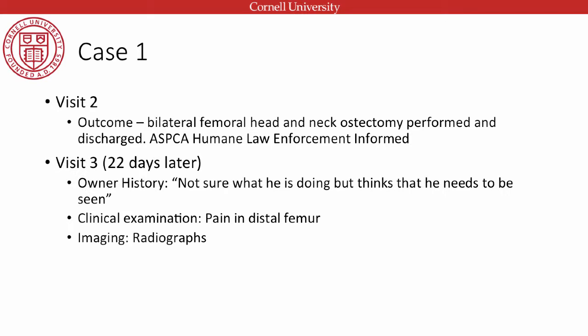Visit 3, which is 22 days later after the thrown against the wall incident. Owner history, not sure what he's doing, but thinks he needs to be seen. So very, very vague. Came into the hospital, clinical examination, pain in distal femur. And we got some radiographs.